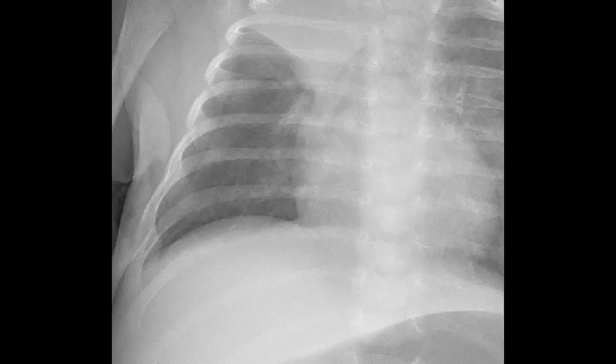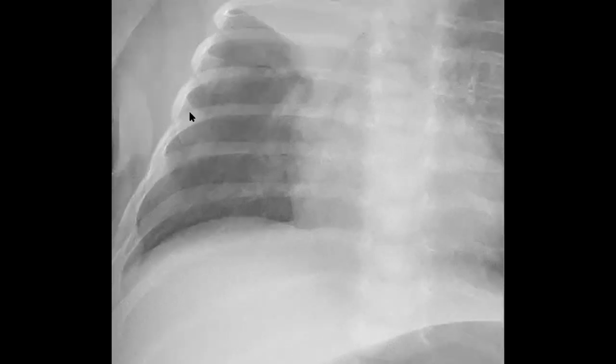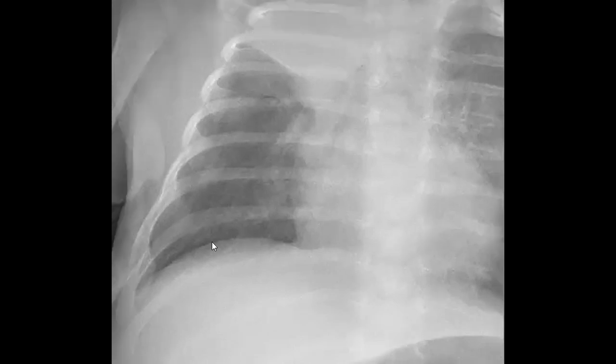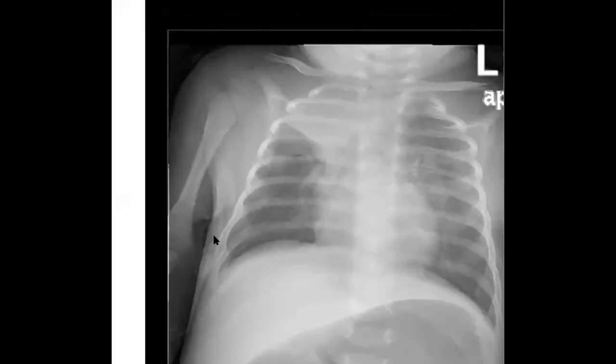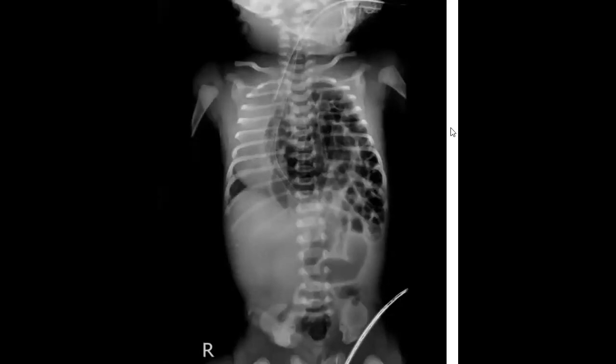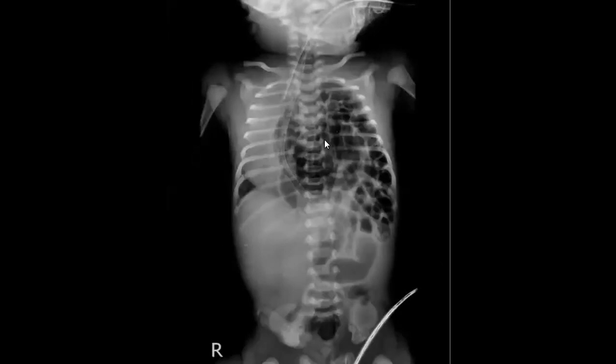So you have like, yes, Dr. Sobhi, perfect. So this is what is called a fold. It is not pneumothorax. Why is it not pneumothorax? Because you can still see lung markings here after it, and also if you try to trace it completely, you will find that it is interrupted. You cannot trace it here at least. So this means that it is not a true pneumothorax. This is a skin fold. Perfect. This one is an easy one, but they like it in the exams, and it is important to check for any lines or tubes.